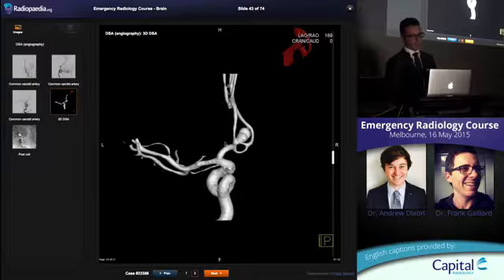And this morphology is very common, where they have a very dominant anterior cerebral artery on one side that supplies both anterior cerebral arteries, with not much on the other. If you injected the other side simultaneously, you'd see there'd be a hypoplastic A1 segment here. And because of the increased flow, that's where the aneurysm arises from. About 30% of all aneurysms will be anterior communicating artery aneurysms.